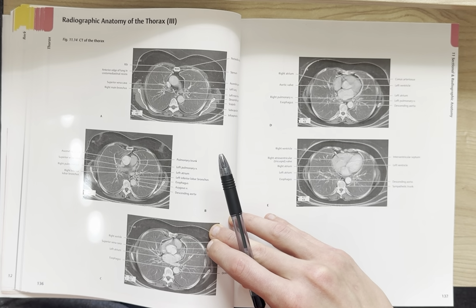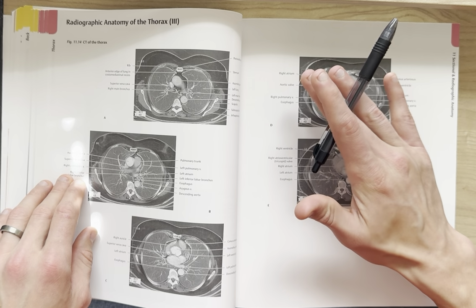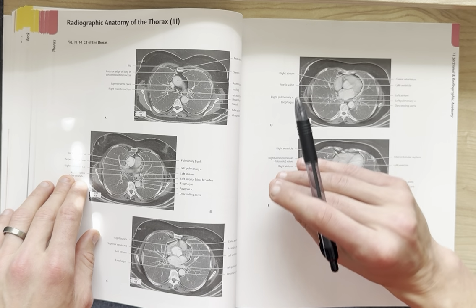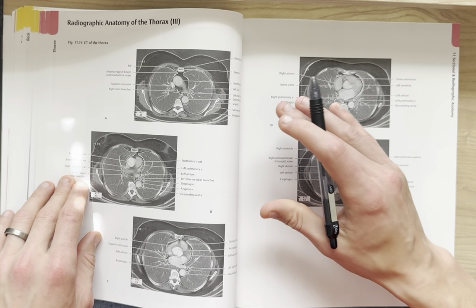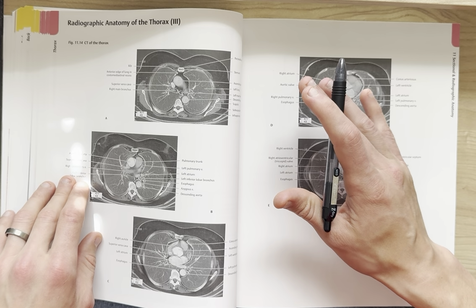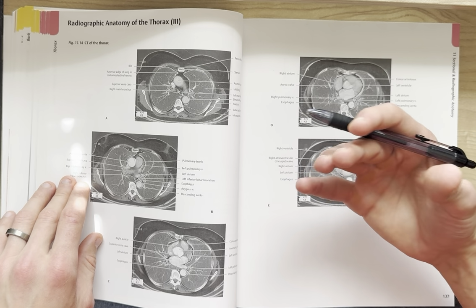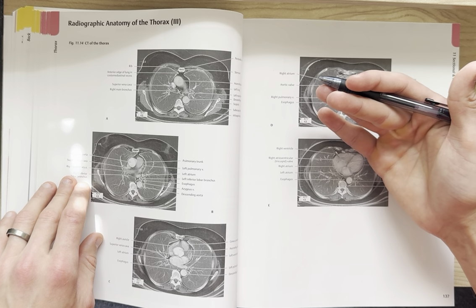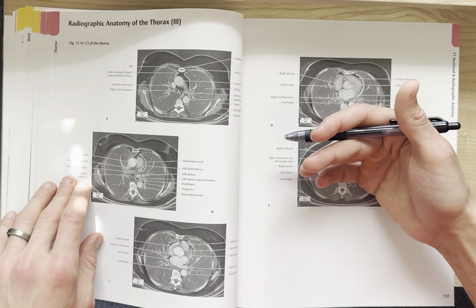Now, a quick note about CTs versus MRIs. A general rule of thumb, not always directly applicable across the board, but CTs are known for being very good with picking up on bony structures. They're utilized in different ways, of course, but if you want to rule in or rule out a fracture on a major bone or anything like that, CT is often the way to go.